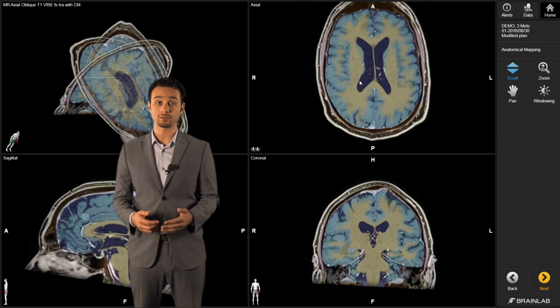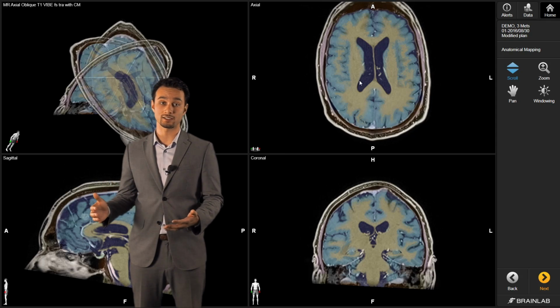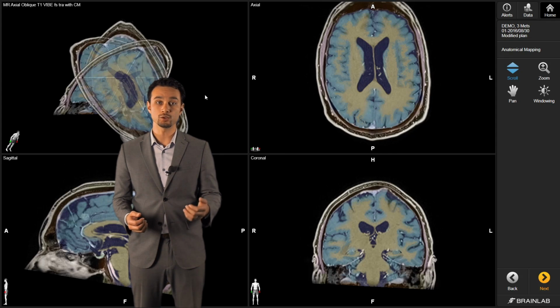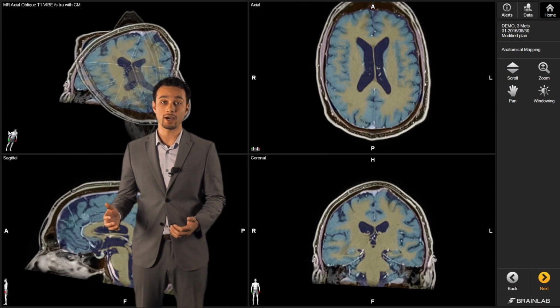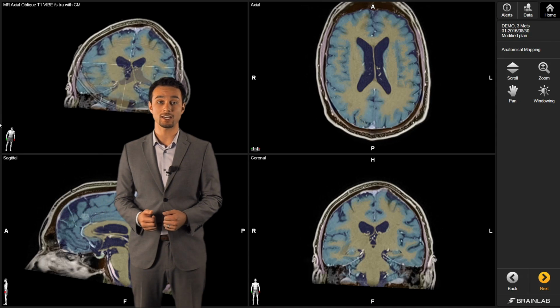However, it can't account for all the variability in patient anatomy, and it also can't account for all the variability in imaging modalities. We have fat suppression MRs, we have T1, T2 sequences, and the tissues are constantly changing what their values are. When you're using golden data from an atlas, this makes it very difficult to arrive at an accurate contour. Moving forward into anatomical mapping, we've moved away from atlas segmentation and into a tissue classification based model.